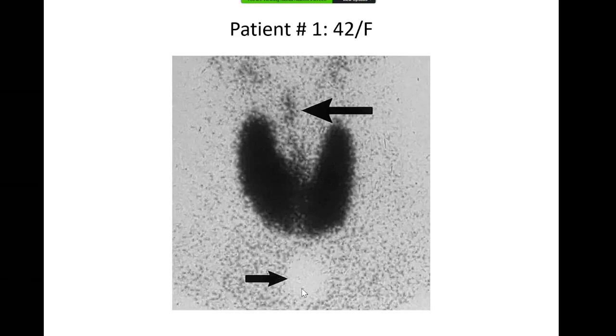And what anatomical structure is this arrow pointing to, put it that way. It's not a pathology, just some normal anatomical structure. So this is basically the suprasternal notch. And why do you put a cursor around here? Because you want to rule out any retrosternal extension of the goiter. So in most thyroid scans, you would see either an arrow or a marker to indicate where the suprasternal notch is.